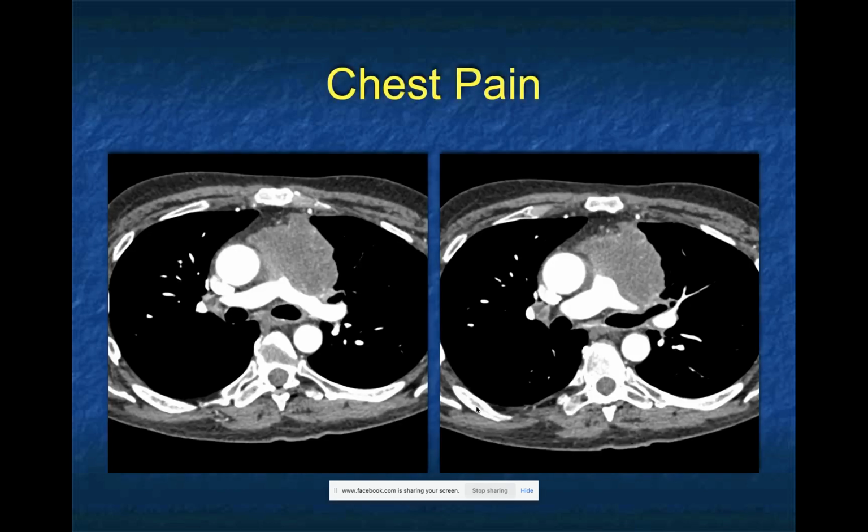You see a large anterior mediastinal mass, in some ways similar in location and not that much difference in size compared to the other case. But the issue here is, look at the mass in relationship to the pulmonary artery. Previously, the other mass was distinctly separated from vascular structures. Here, the mass looks like it's growing posteriorly, and it's narrowing both the left and right, especially the left main pulmonary arteries. There's infiltration. Again, that same differential. Lymphoma is a thought. It could be lymphoma. Doesn't look like teratoma. Doesn't look like thyroid.